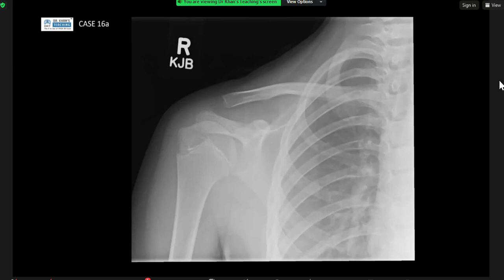Okay, so what if I tell you that you can feel a palpable lump or pain at the medial clavicle on the right? At the medial clavicle at the right. Mm. Okay. I might see like an expansion seen at the medial aspect of the clavicle, however, no cortical disruption or periosteal reaction.